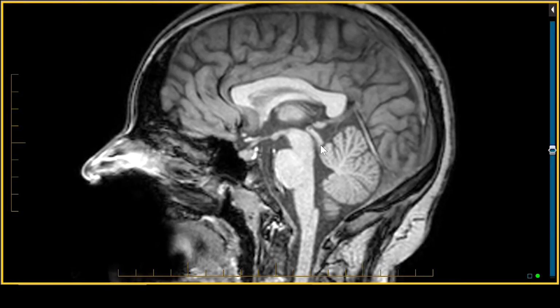Pomerantz out. Let's take a look at the sagittal midline cut, the guts, the heart and soul of MRI of the brain, where you might use this sequence, and especially this projection, to look for anomalies of the brain in pediatric patients. I want to talk about the commissures.